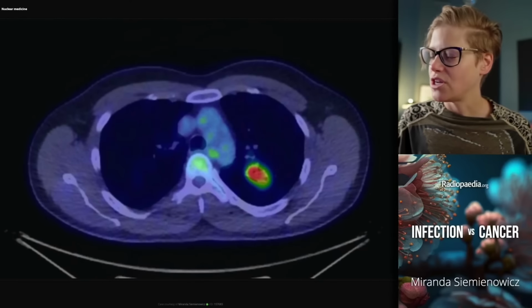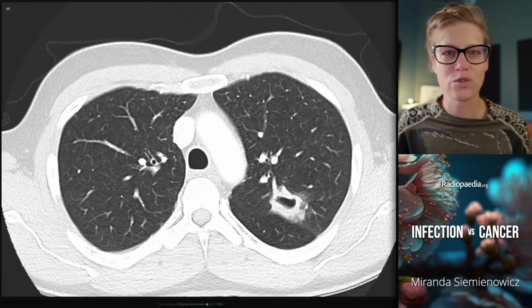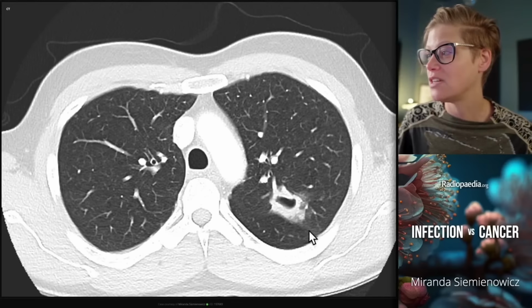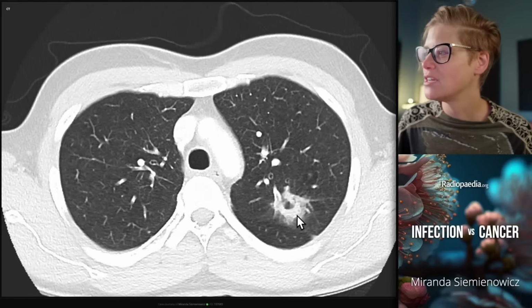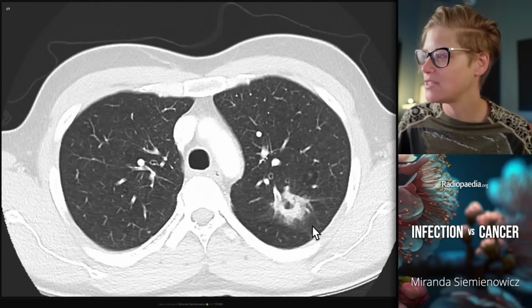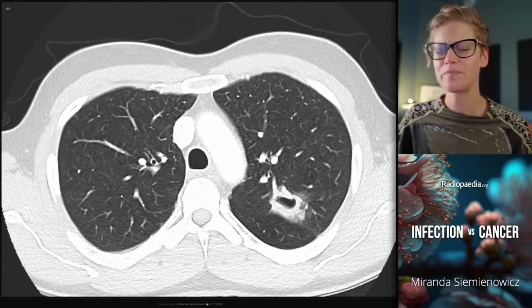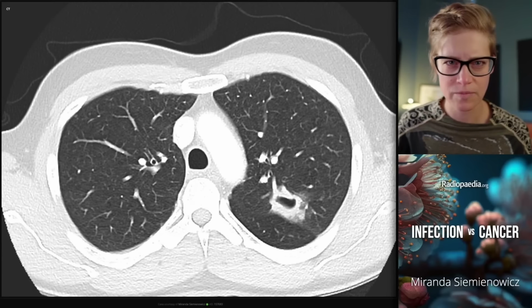The patient changed institution with their care, and a very short interval CT was done only 2 weeks later. We already see how much this has increased in size. There's a much larger cavitary component. The lesion now is contiguous with some ground glass opacity. It's become more ill-defined. It's more ovoid in general morphology. It was reported as rapid increase in size, presumed malignancy.